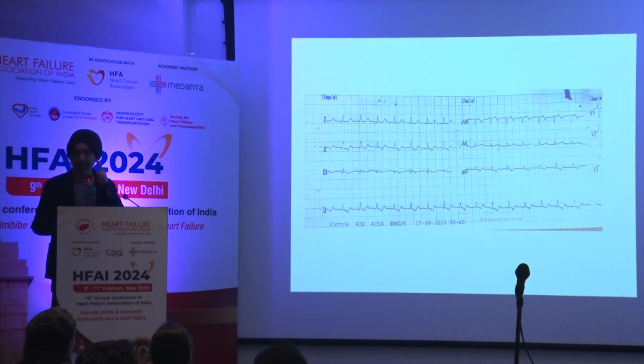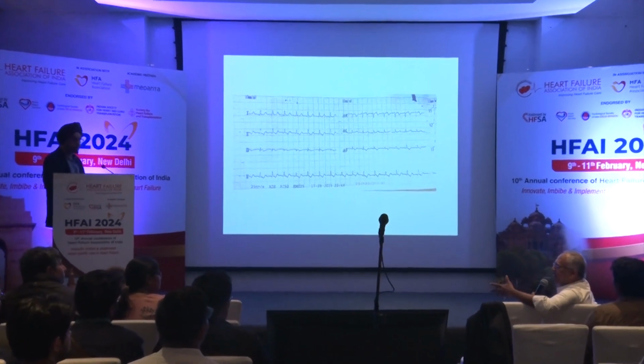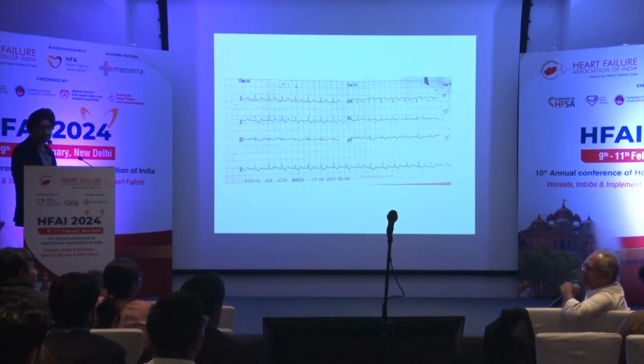Narrow QRS tachycardia, regular relationship between P and R, RP is shorter than PR, and it has only three differential diagnoses. Simple. Narasimhan, anything else? By law of averages, you don't have a person at 76 for the first time presenting with an accessory pathway mediated tachycardia. It can occur, but it's unlikely.